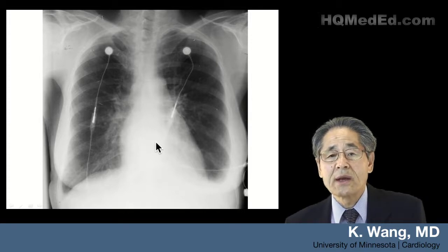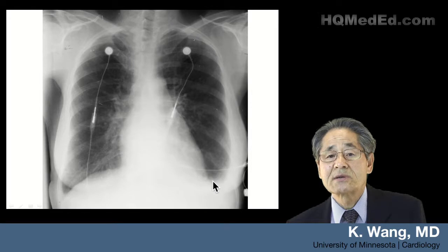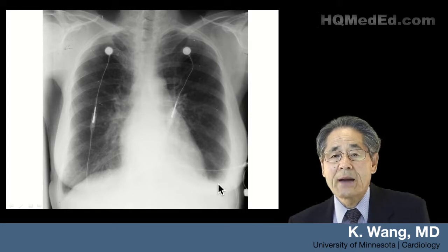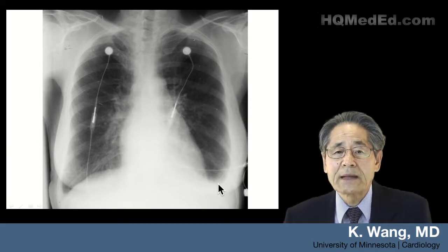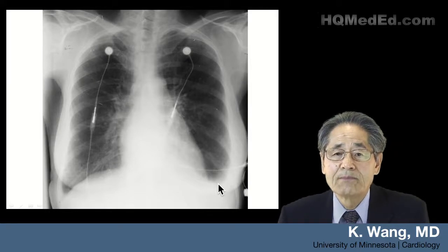What the X-ray is telling me is that there's an obstruction at the mitral level with the enlarged left atrium, left atrial appendage, increased pressure causing Kerley B lines, and some congestive heart failure causing pleural effusion. So what could obstruct the mitral valve level without mitral stenosis? And it occurred to me that maybe I'm dealing with a left atrial myxoma.